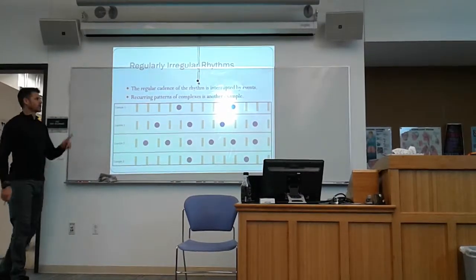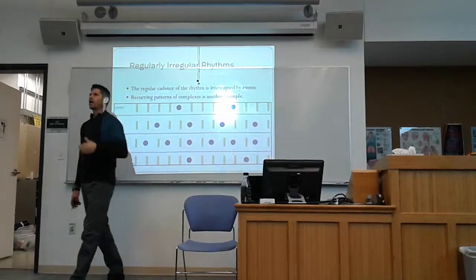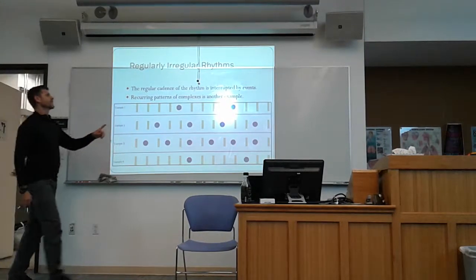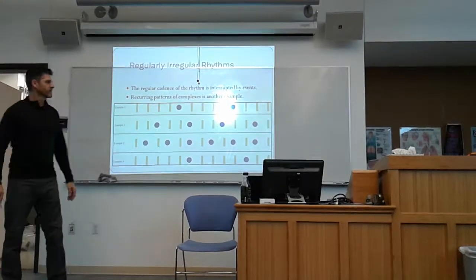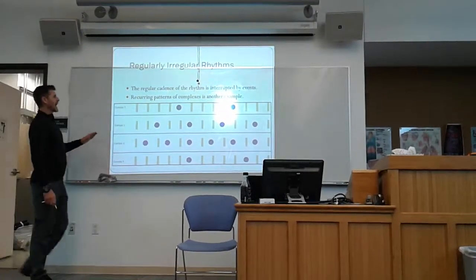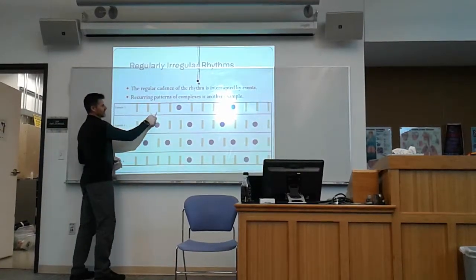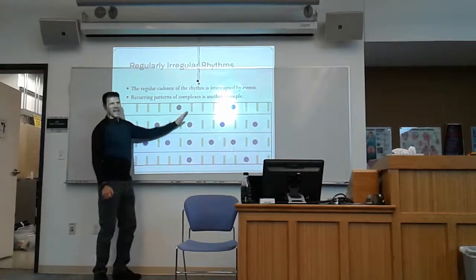Pretend that all of these yellow lines that you see there are QRS complexes, and all of the blue dots are QRS complexes, but different. The blue ones are different somehow than the yellow ones. If I have these QRS complexes that march out, and that's great, and then something happens.